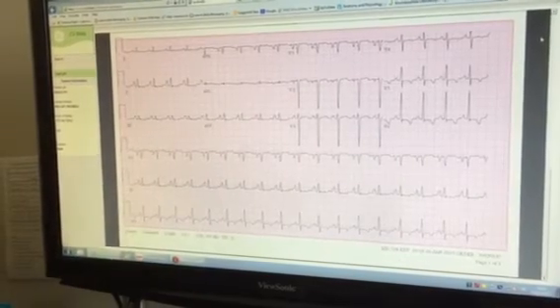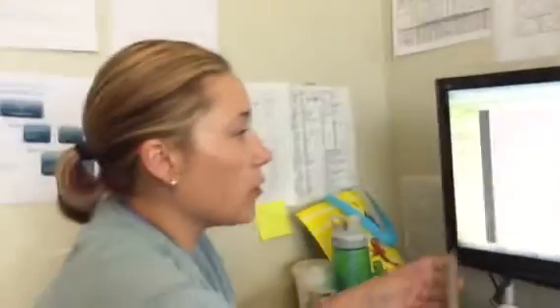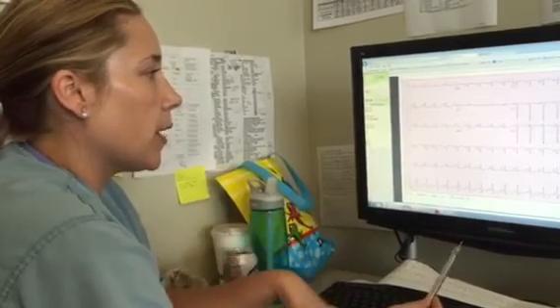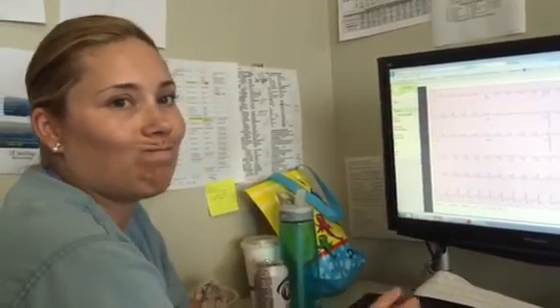So those are some of the typical findings you would see and expect. We don't see any abnormal ectopic beats such as a PVC or a PAC, but these findings are consistent with someone with a low EF.